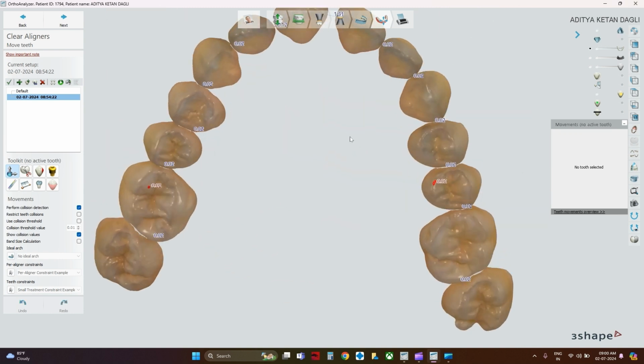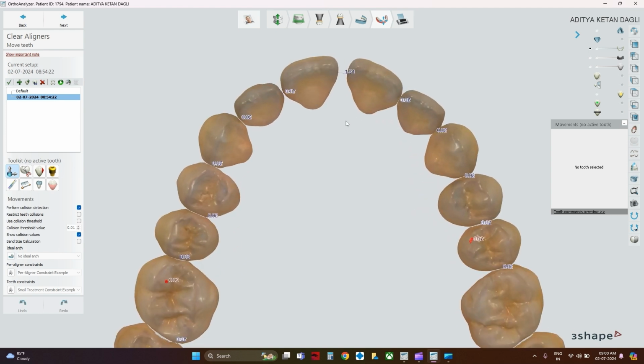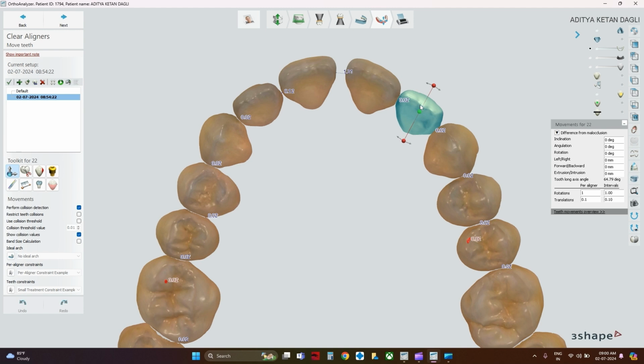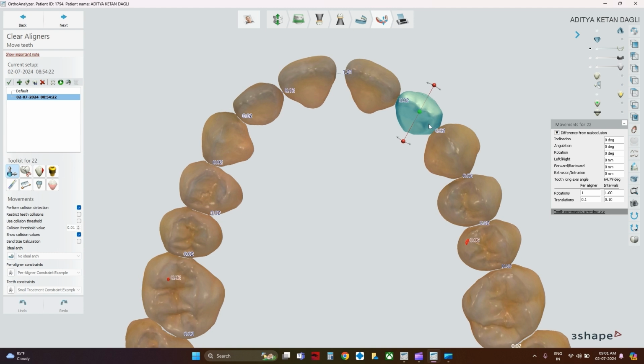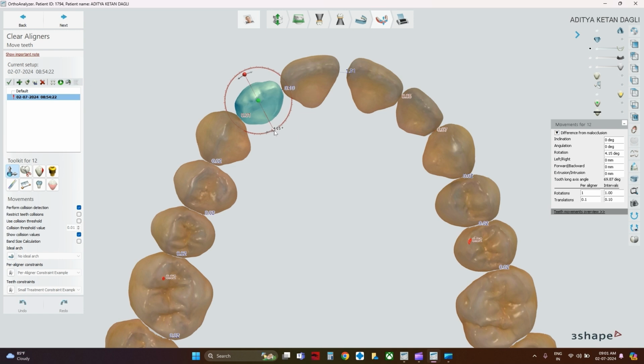Now let's go back to the upper arch. If we notice, we do have to correct some amount of rotations between the laterals and the centrals. So we will again apply the same concept. Sometimes, if you wish, not to just rotate it like a couple and to have a pivot or a hinge type of rotation, we will see how to do that. For this lateral, I think it's better that it undergoes a normal rotation like this. All right, same for this.